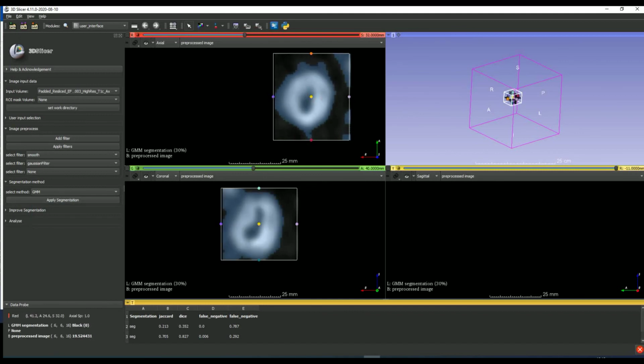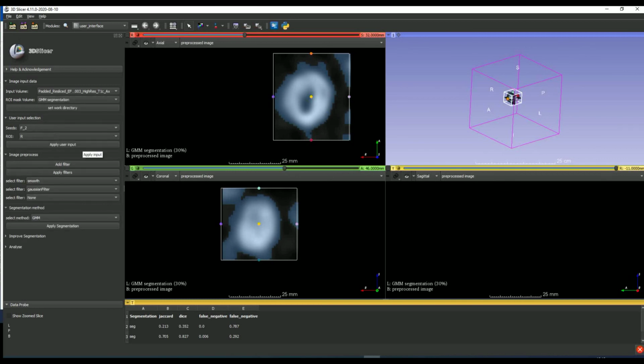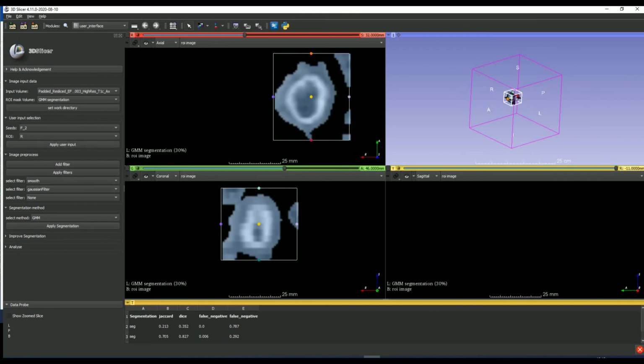This is on purpose because I want to present a good use of the GMM. The GMM was found to be not a very good segmenter, but for this type of use, it is pretty good. It segmented the general region where the tumor exists, and then that segment can be reused as a mask and used to mask out regions that are definitely not tumor. So it kind of localizes the region and allows us to continue working on an image that's more oriented towards the tumor itself.